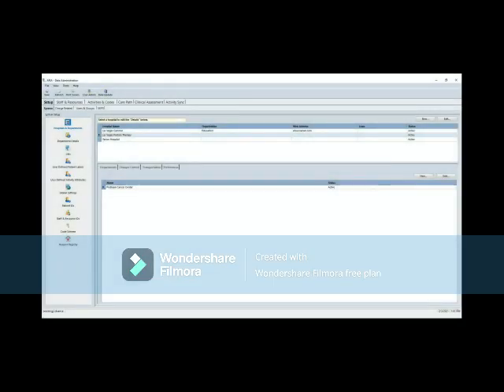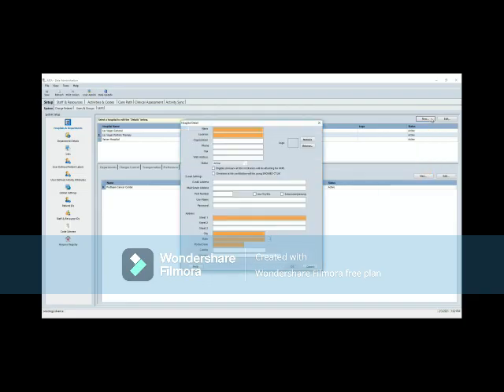To create a hospital, navigate to Data Administration. Select Setup and then System. Select Hospitals and Departments. Click New. Type the hospital details. For USA only, if the hospital is attesting for MIPS, select the box for eligible clinicians at the institution.